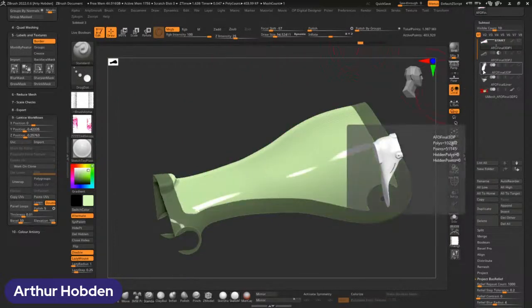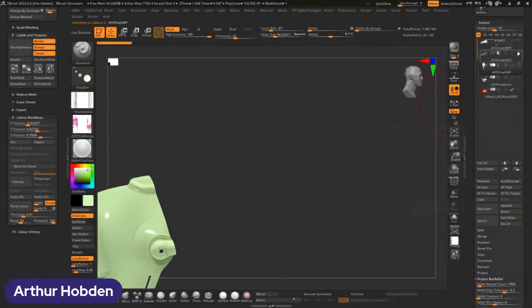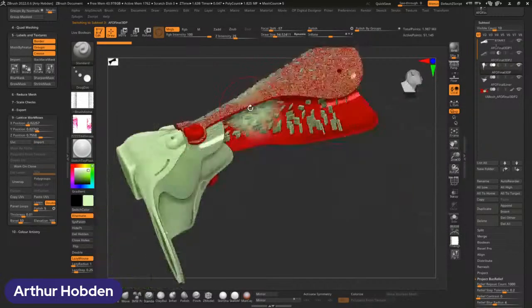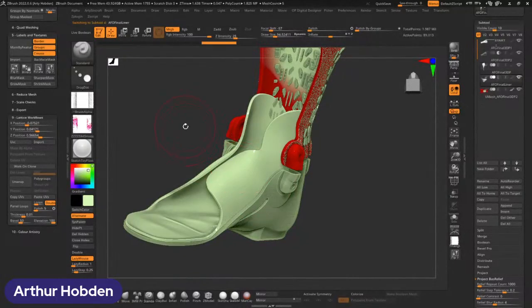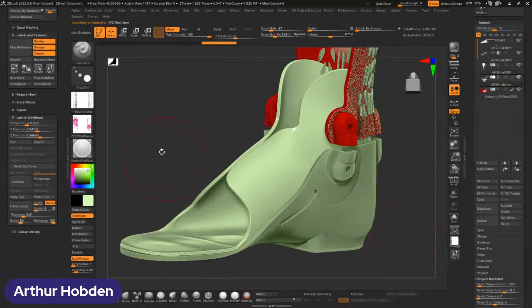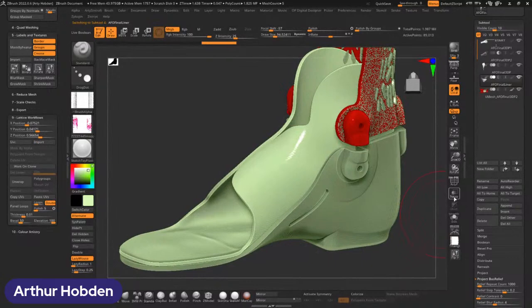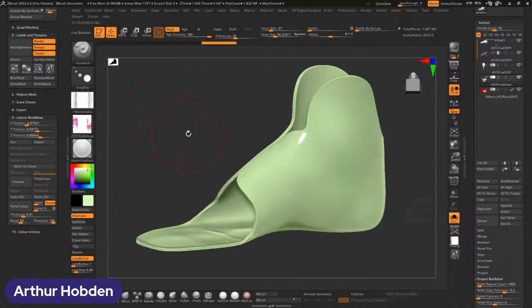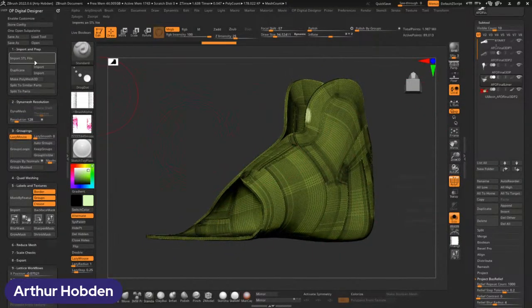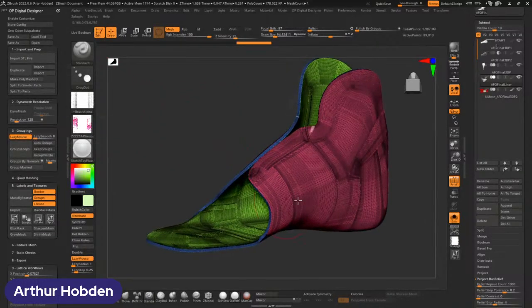One final thing that's pretty interesting is, if I go to the liner here, a lot of liners want some sort of latticing to happen so that you can make it more flexible. So what happens if we just work on this for a second and repeat all those steps to create a hexagonal lattice around this part? So we're going to group by normals. We're going to then remesh at a high resolution. Actually, no, we're not. Group like this.